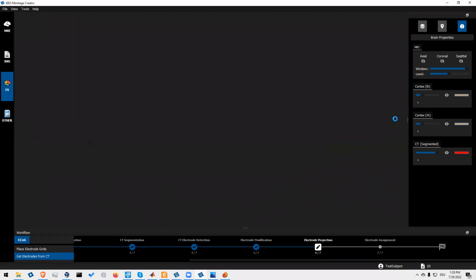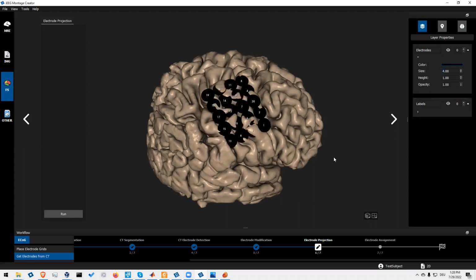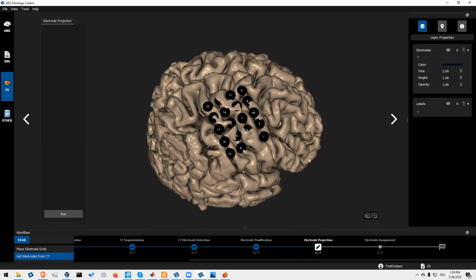So we can go on. And like you can see here, in this control panel, it's the same as in the 3D scopes. We can, for each step, control the visualization and decide what we want to see and how.